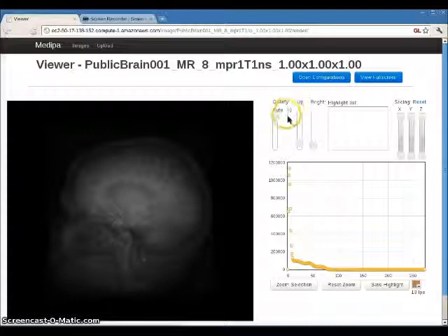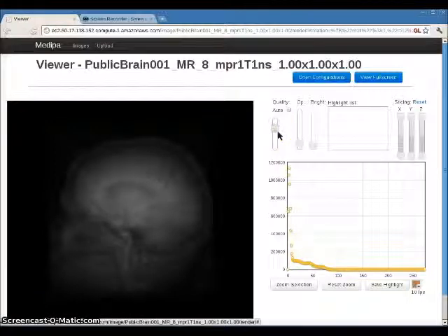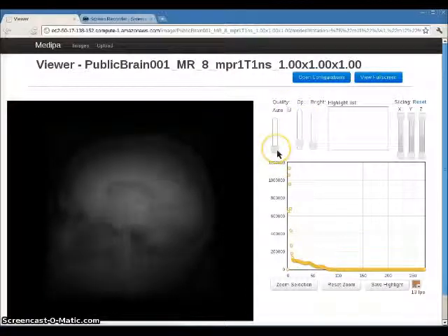And we just keep doing this process until we're actually rendering the full image. And at any time, you could disable the auto adjustment, or if you just wanted to reduce it or increase it to push your system a little bit more, you could. And this all happens in real time. So for example, here's the 512 reduction, and then as we scroll up, it goes up to the highest.